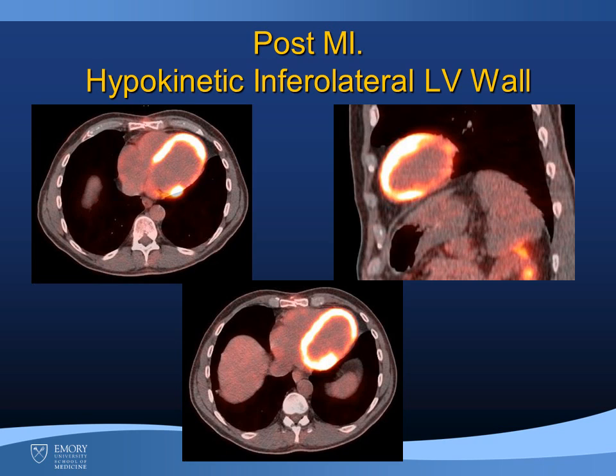Another patient with a discontinuity in the lateral wall. And this patient was post-MI and had a hypokinetic infralateral LV wall consistent with scar.